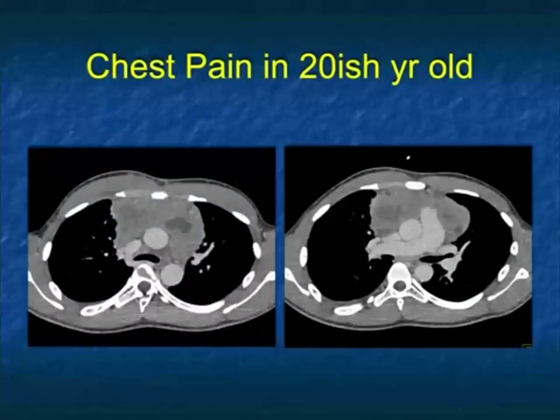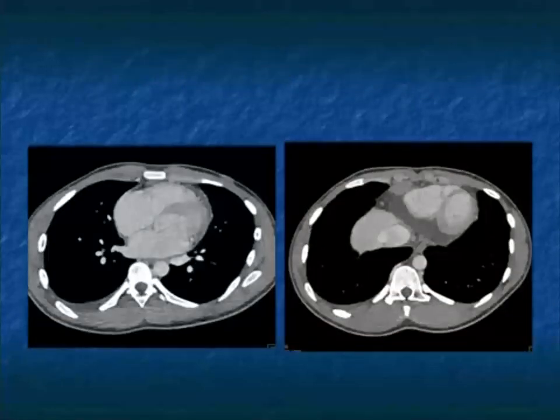Okay, a few chest cases. Large anterior mediastinal mass, somewhat cystic. A key finding here is involvement of the internal mammary region and involvement of the chest wall. When I see in a young patient a big mass, you go through the things: teratoma, but no calcification, and it wouldn't go through the chest wall. Thymomas are rare. Lymphoma is the thing that has cystic areas, like this case has, also involves the internal mammaries, can go through the chest wall.